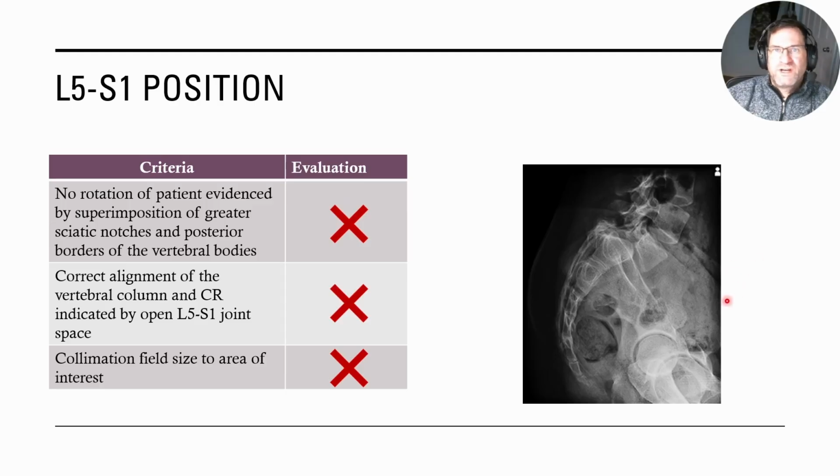So on this, we have rotation. You can see it with a greater sciatic notch here and here. They're not lined up. Also with the acetabulums here and here, not really matching either. So as far as correct alignment, it didn't happen on this. Our collimation should be right in this area, and it's like a mondo.